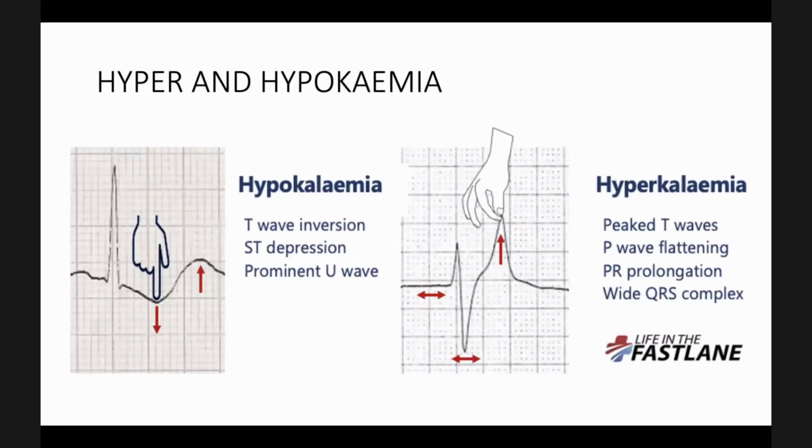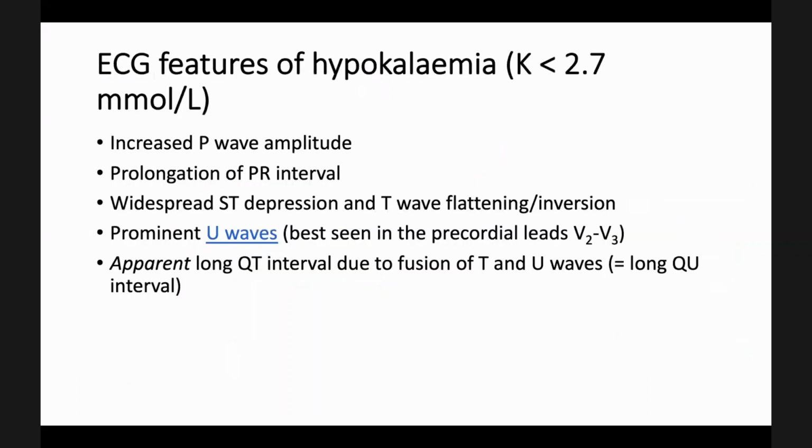And now we'll move to hyper and hypokalemia. We'll see some ECGs of hypokalemia as well as hyperkalemia. So what are the features of hypokalemia?